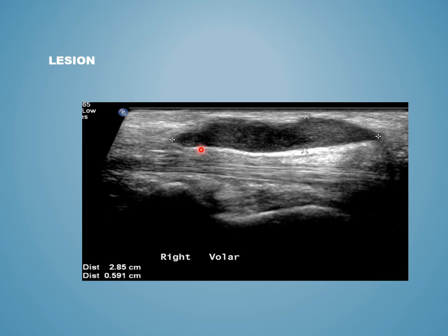This is an example of a hypoechoic lesion seen in the subcutaneous tissue, with an appreciable space between it and the underlying tendon. This lesion will go into a differential diagnosis. It may be hemangioma, leiomyoma, a neurofibroma. Also, malignant lesions could not be ruled out, such as synovial sarcoma. So, in musculoskeletal imaging, some benign-looking lesions are in fact malignant. So, biopsies in most cases are preferable.